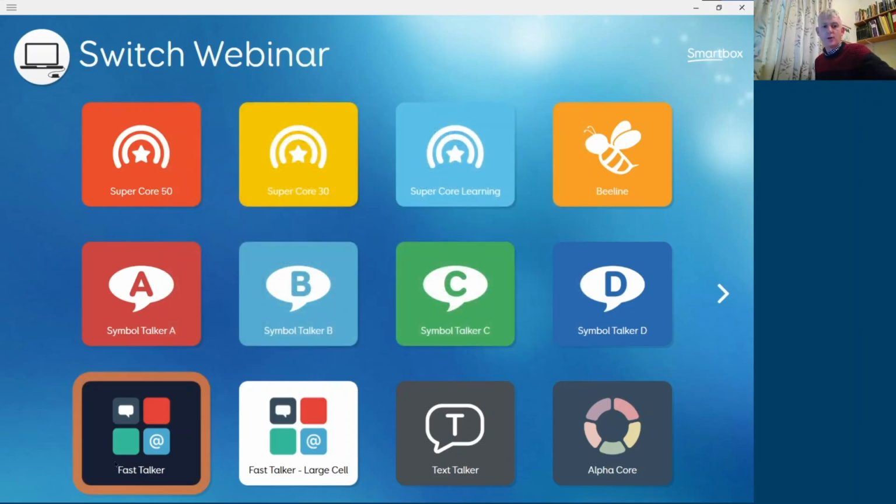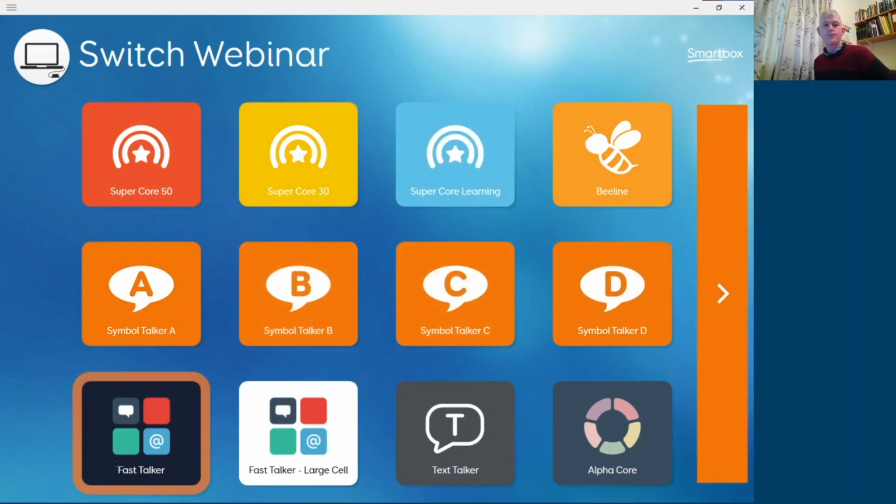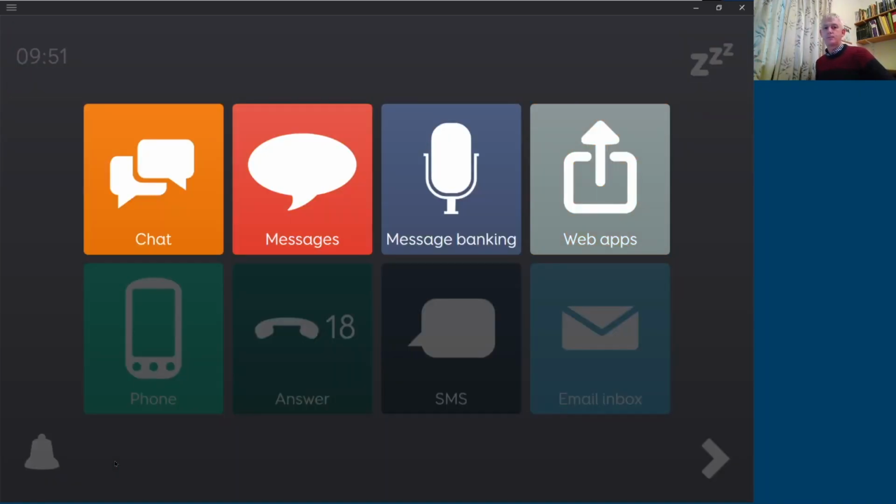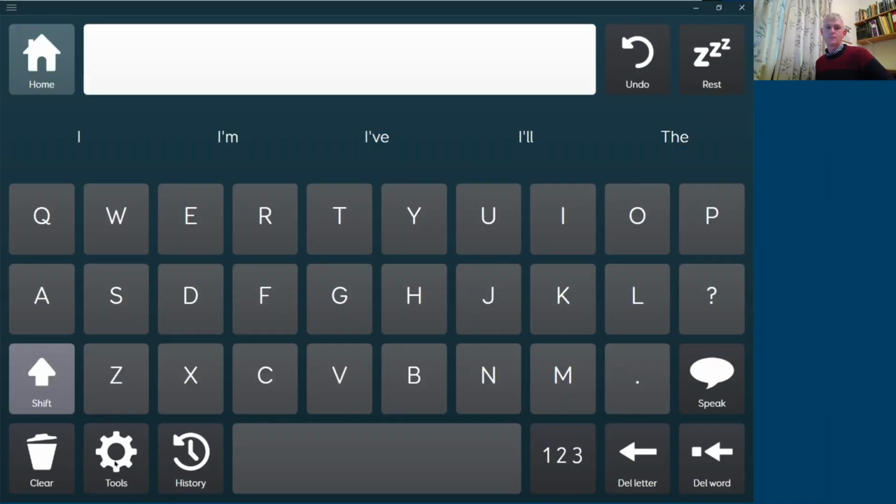I'm going to go into Fast Talker. And then I'm going to go to my chat keyboard. Okay, so I'm on my chat keyboard. And I'm going to begin to, maybe I want to select a double E.